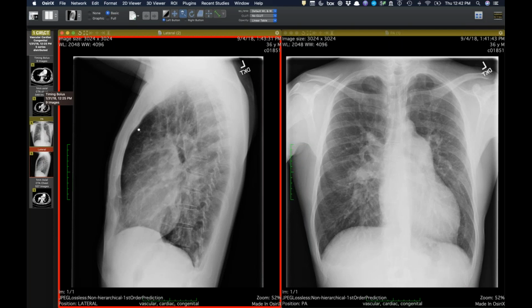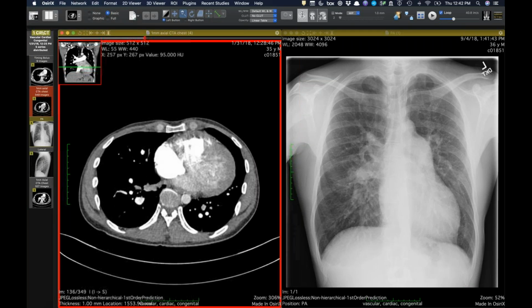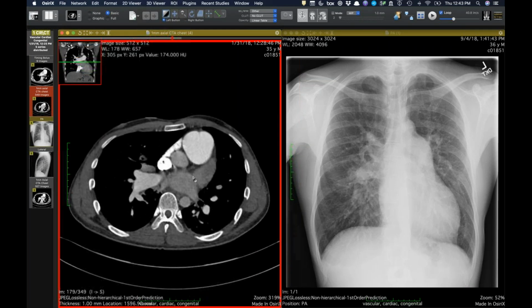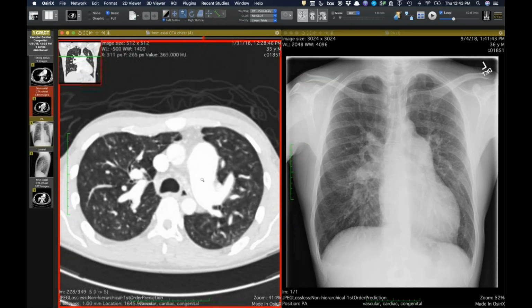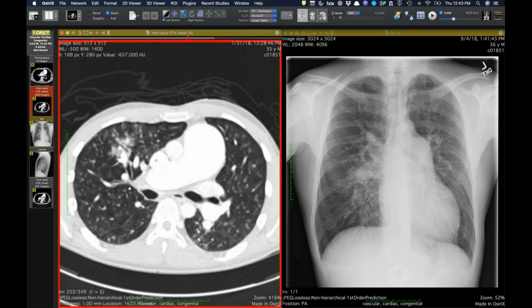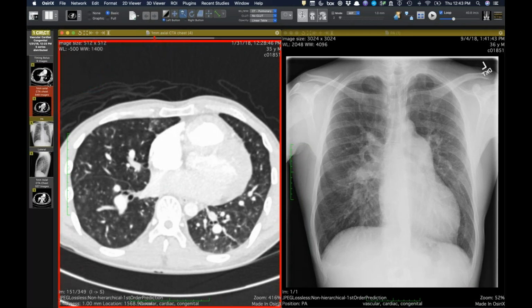And so this guy comes in with recurrent hemoptysis. No surprise, he has pulmonary hypertension. But what I think is interesting in this case is the cause of this: he had an untreated huge VSD that you can see here as the cause of his pulmonary hypertension, with a really large main pulmonary artery, and typical findings, as Jeff mentioned earlier with the case of follicular bronchiolitis, that we see with pulmonary arterial hypertension, with the little smudgy centrilobular ground glass nodules in addition to his areas of hemorrhage.